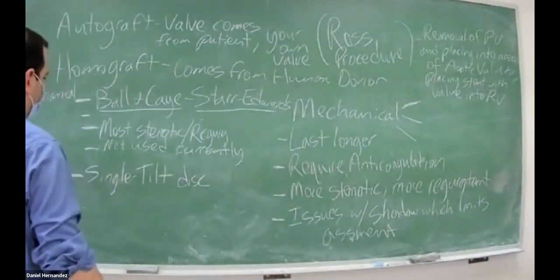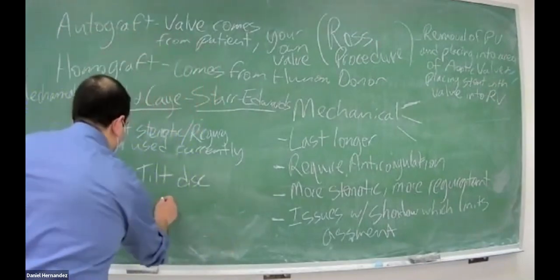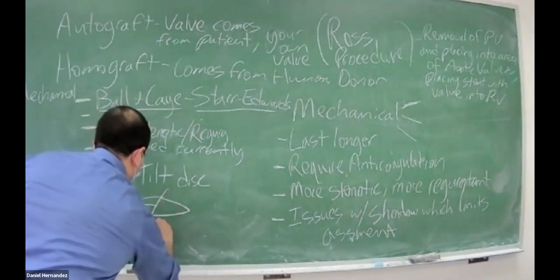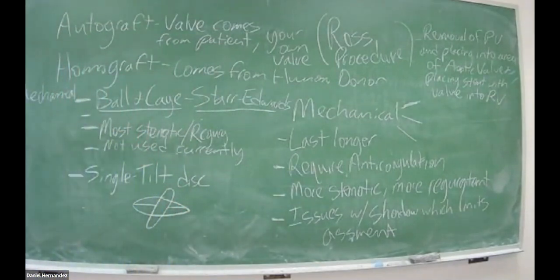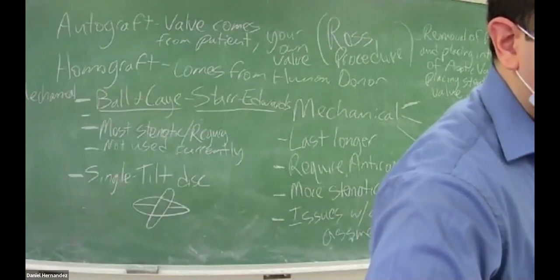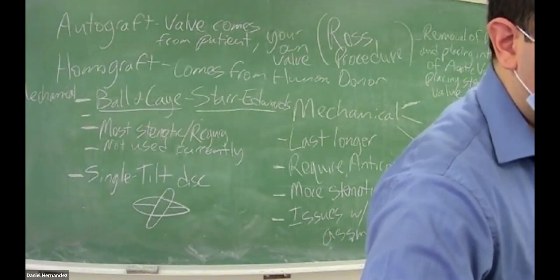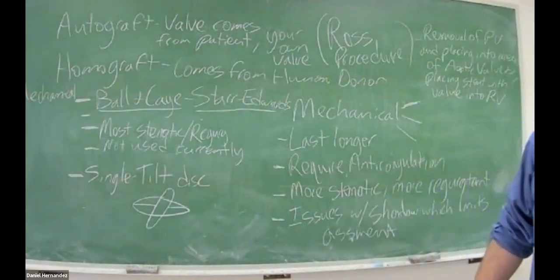Then technology advanced and we created this single tilting disc valve, with a single disc that opens and closes. So this is the Bjork Shiley.